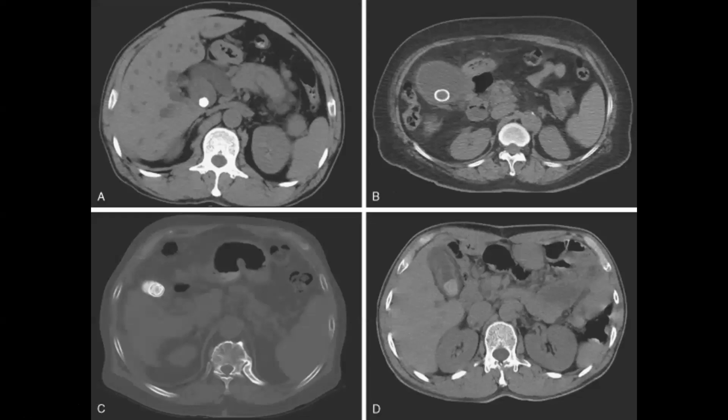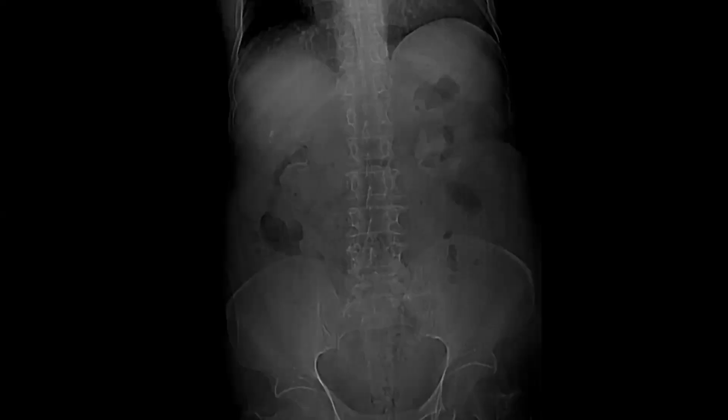Stones can have different morphologies on CT scan. They can have soft tissue density. They can have peripheral calcification. They can have onion peel appearance or rings of calcification, or they can be completely calcified. Sometimes they can be fluid density and not detectable. So CT is not very sensitive to detect stones. 20% of gallbladder stones are radiolucent on CT and cannot be seen on CT scan. The most sensitive modality to look for gallstones is ultrasound, much better than CT to detect gallstones. If you cannot do an ultrasound, maybe an MRCP is also very sensitive.